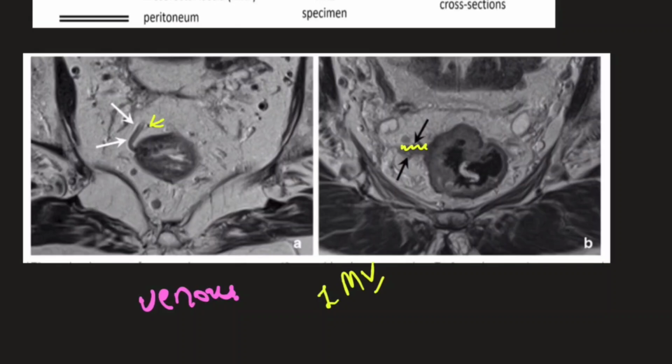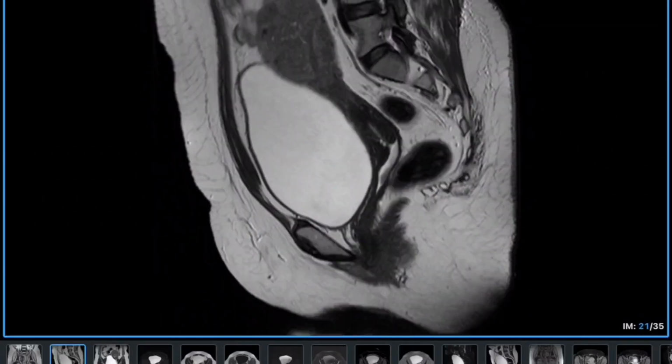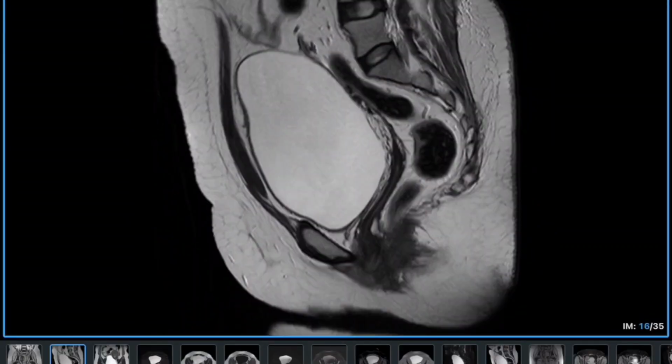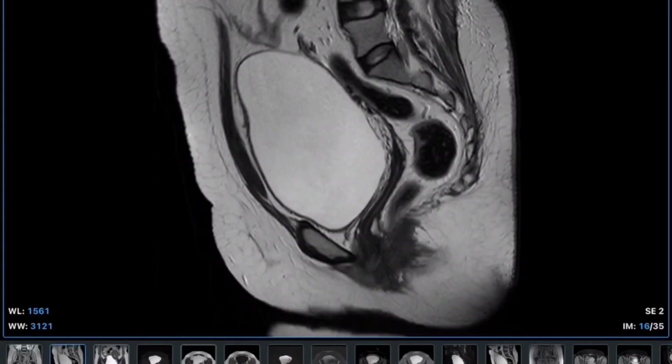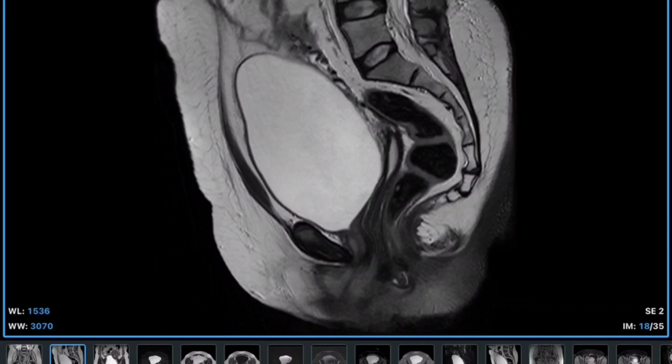Okay. So rectum is the distal 15 centimeter of GI tract. So this is the anorectal junction. This is the anal verge. Okay. This is the anal margin. Okay. And this is the sigmoid takeoff. This is the distalmost 15 centimeter of rectum.